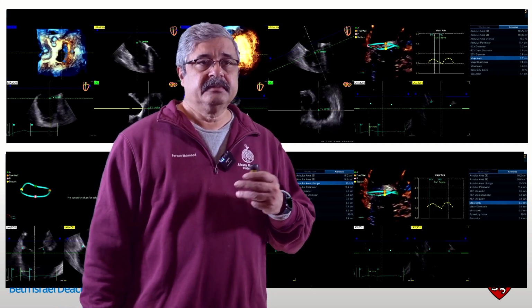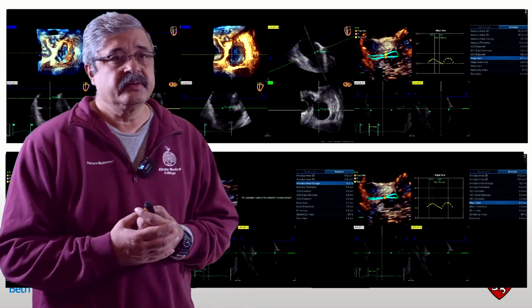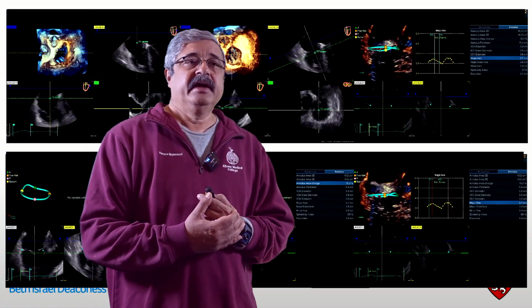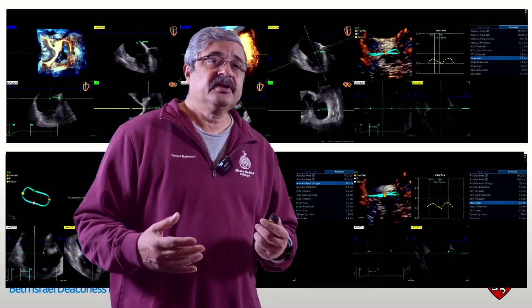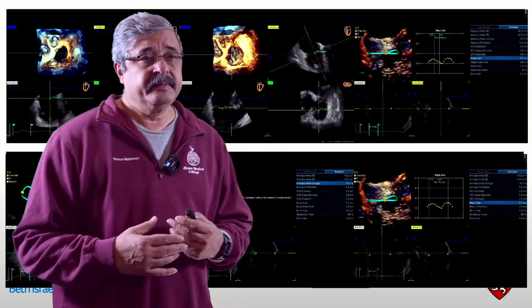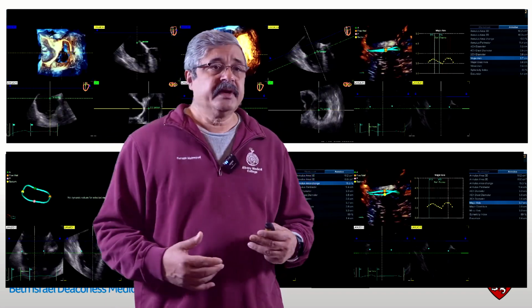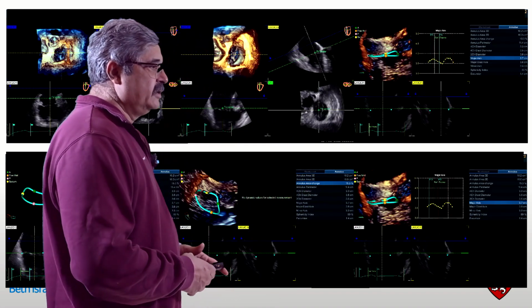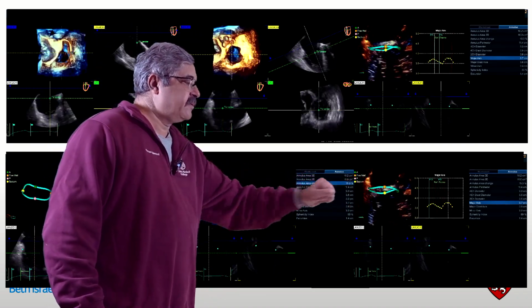So this concept of dynamism was adopted by a few of the ultrasound companies. This is software that is now commercially available in the General Electric machines, the E95, where, based on adequate frame rate, a 3D volume of the tricuspid valve can be automatically or semi-automatically tracked to demonstrate the tricuspid annulus within its position in the tricuspid valve.